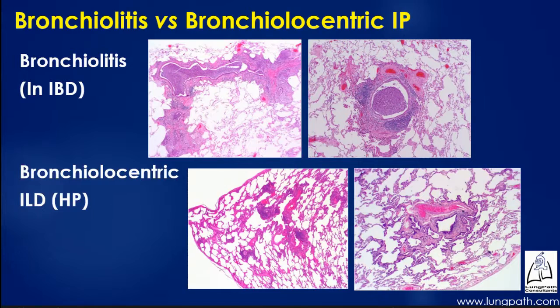Pathologically, you can see that not only is the airway involved, but some of the surrounding alveoli are affected as well. So that then on the left-hand side, you can see that most of the inflammation is centrilobular with sparing of the pleura, but the inflammation does trickle out into the alveoli around that. Similarly, on the right, in this example of peribronchiolar metaplasia, there is abnormality to the airway and then involvement of the alveoli around that airway.